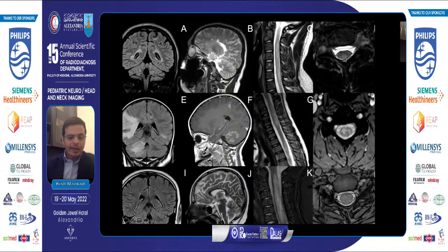Eventually, if you have a brain like that, where the child is presented with vomiting, you're not seeing much in the way of lesions, but you may have lesions involving the hypothalamus or even the area postrema, not clearly shown here. But you have a pretty large lesion load. You can have bubbly lesions in the spinal cord as well. You're going to call that aquaporin 4. Multiple sclerosis, MOG, and aquaporin 4.